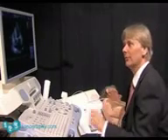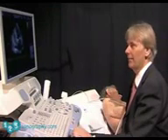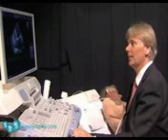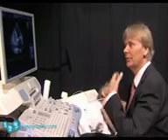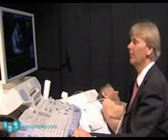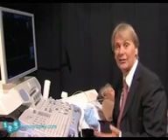And we also know that the reason for its mitral stenosis is not rheumatic heart disease, but annular calcification. This patient was on dialysis and then received a kidney transplant, and we see those degenerative changes very often in patients with kidney problems. Okay, so this just gives you a bit of a feeling how we go about a situation where a patient has diastolic dysfunction, and we can't use pressure half-time to quantify, and where even the mean gradient is sometimes difficult to interpret, and also planimetry is not as easy.